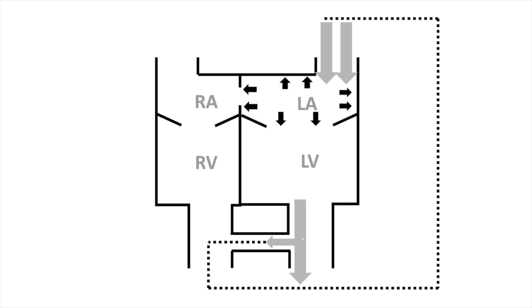And then the more blood that returns back to the left atrium, it's going to cause dilation of the left atrium. So the point here is that the left atrium gets dilated. However, the aortic valve area is not going to change because it's technically fixed. This will make the LA-AO ratio go higher, and the higher it is, the more consistent with pulmonary overcirculation.